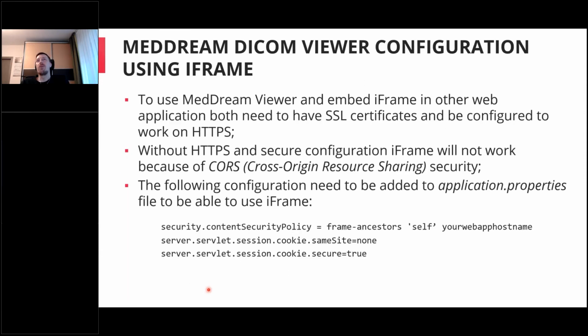Also, if we talk about security with the SSL certificate, some clients want to integrate MedDream Viewer in an iFrame, showing a specific study from the MedDream Viewer on their web applications and websites.